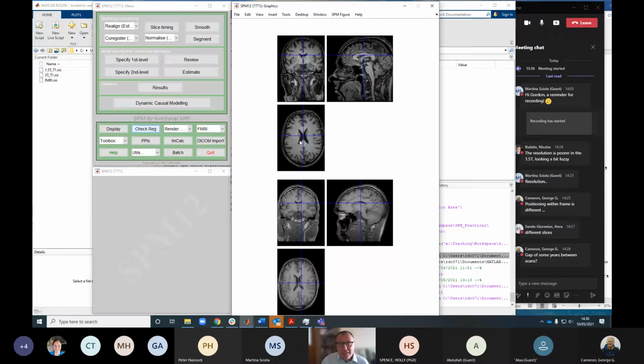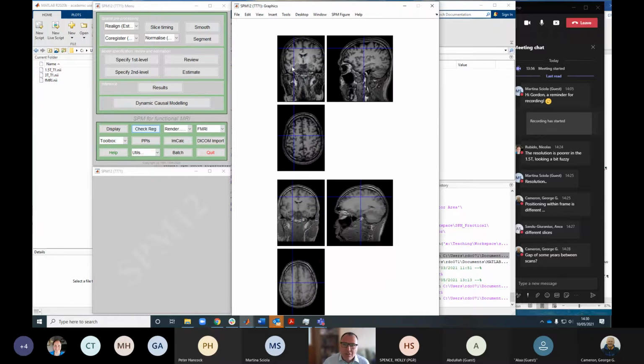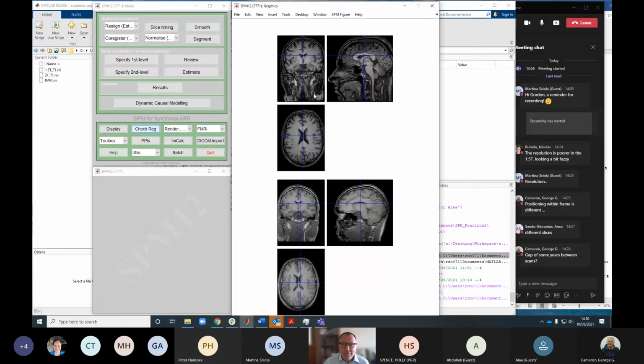So just an aside, in terms of allowing you to click around the data and see, some of the things that you pointed out about being different slices, positioning being wrong within frames, those sorts of observations are useful, and we'll use them a bit later to check that some of the image pre-processing tasks have worked correctly. Because like most things, it might not work.